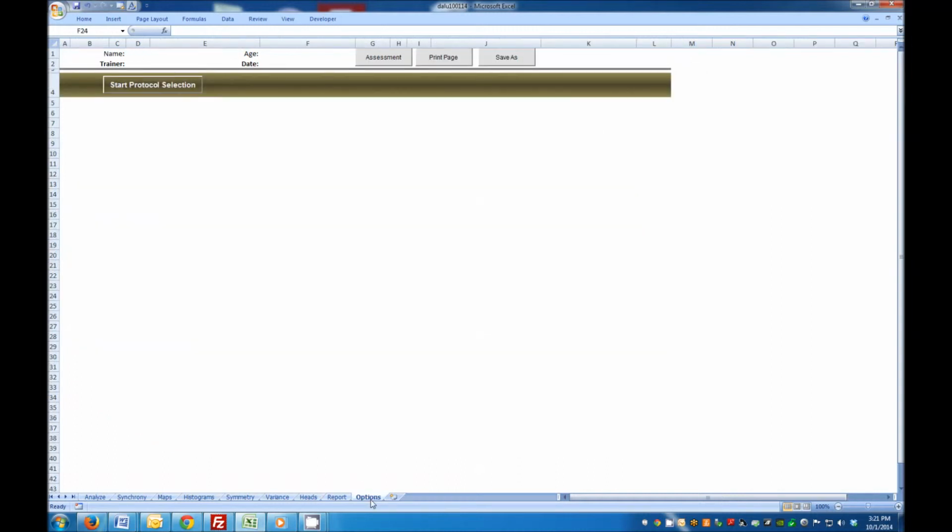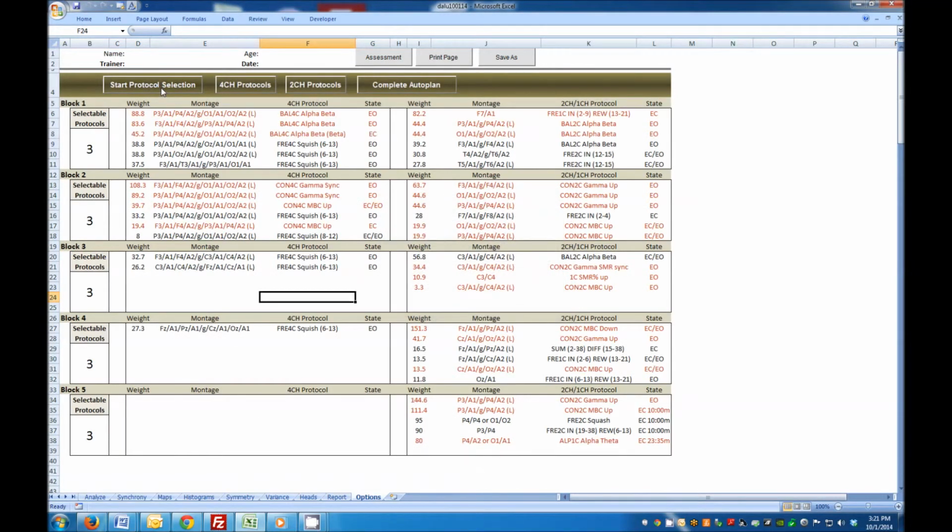And I can click here on the button that says Start Protocol Selection, and it will go through and calculate, based on patterns in this brain, what are the options that we have available for training. 4-channel over here and 2-channel over here.